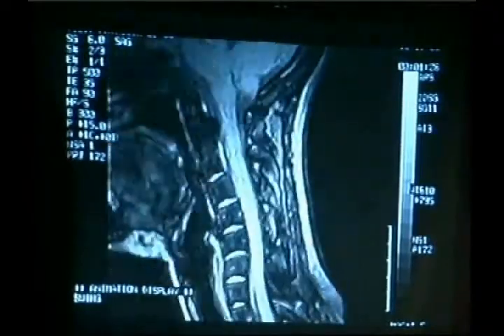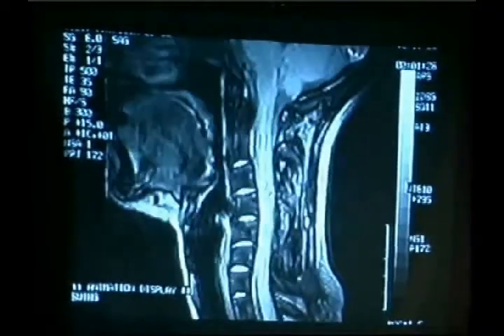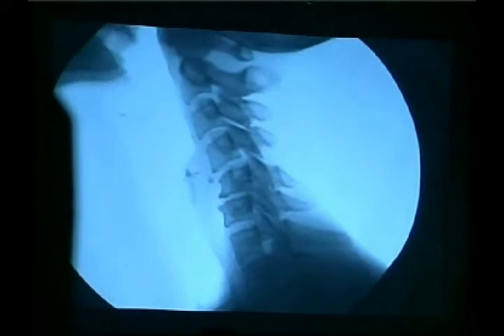Next, what we're going to see is DMX, or digital motion X-ray, which we made the bones black. We made the background white. And our bones almost look like they're outlined with black. Like I took a black magic marker and outlined my bones. Reason is our technology blackens the cortical margin of the bodies. So in other words, we highlight. And you're going to see a couple things here.